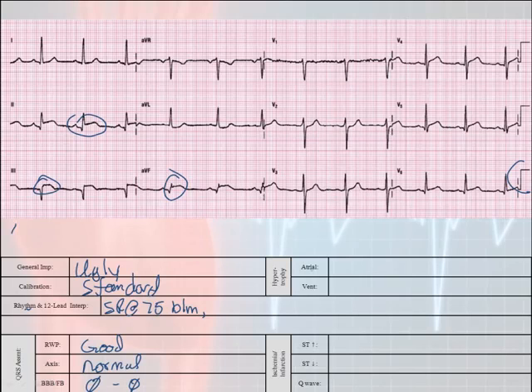How about atrial enlargement? Look at leads 1 and or 2 and or 3. Look at the P wave. Do you see any peaking or humping of the P wave? And I do not. Ventricular hypertrophies. I'm going to look over here. This and V5 and lead 2 looks like the bigger ones. And I'm going to say no over there.